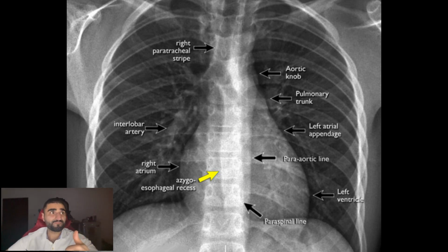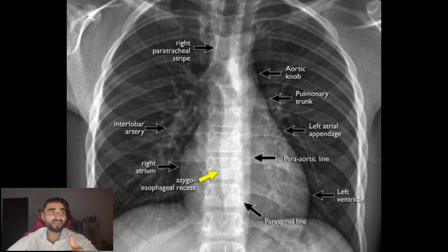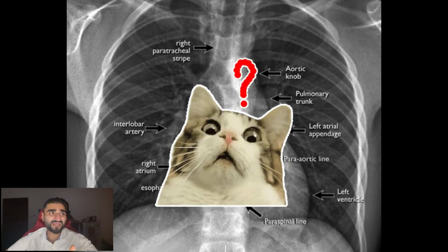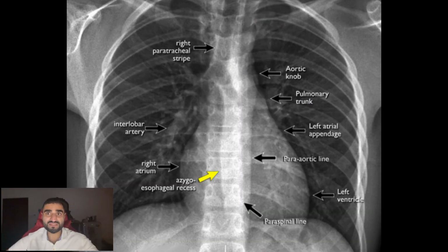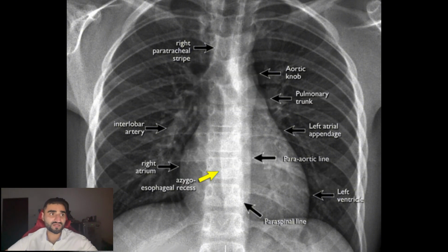We're still at the A. These are the two lungs. Normally they are black in color, not fully black and dark black. You can see shades of gray within it. This is a normal lung. Then you move on to the B, which is the bones. You can have a look at the ribs. You'd usually see around 9 to 10 ribs in a normal x-ray. Then you can compare it to the other side and you can see the spine. If a patient has scoliosis, then you would see a different pattern.